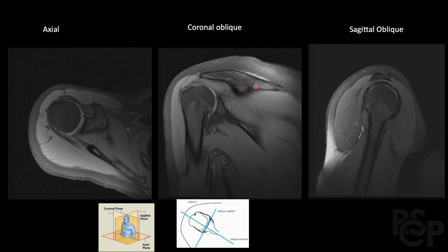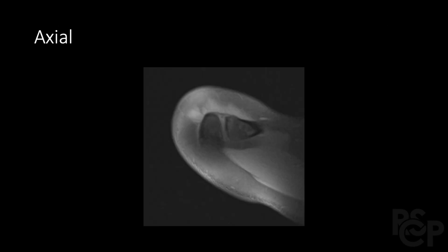So it's important to put these things together to get a better understanding of the orientation. It can be a little bit tricky, although moving up and down, in and out, in an actual sequence, it becomes easier to identify these structures.